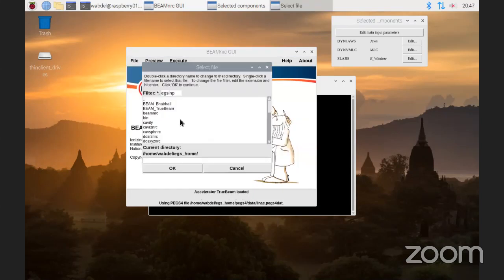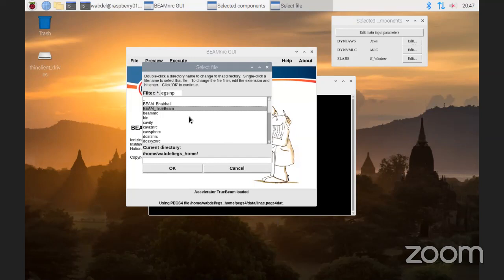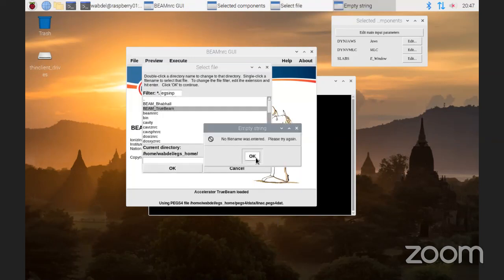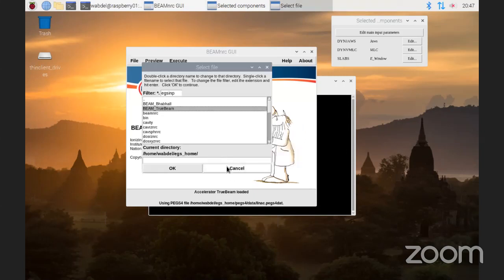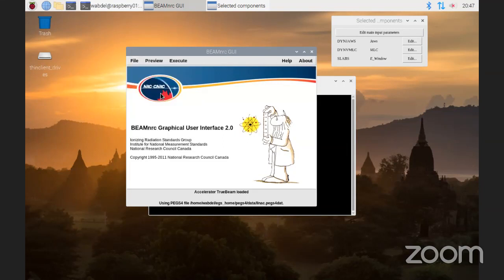If we look at that profile, it looked like one side looked appropriate, and there was just a geometry offset on one side of the profile. So it's hard for me to figure out why would one side be correct and the other side be incorrect. I don't know.